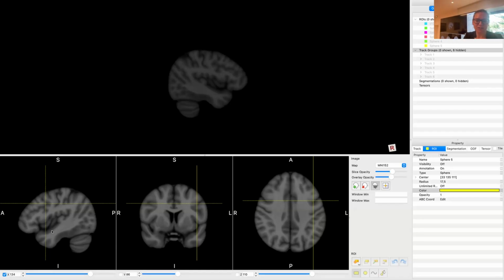But because we only have 15 minutes, we can do a quick one in placing a sphere in the anterior temporal, a sphere in the orbital frontal, toggle them, and then probably add an exclusion to anything behind it. Ready? This is going to be a speed dissection. Here we go.